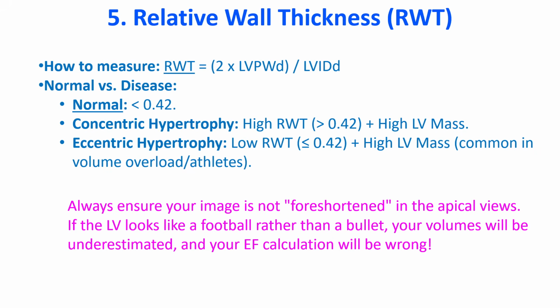Always ensure your image is not foreshortened in the apical views. If the LV looks like a football rather than a bullet, your volumes will be underestimated and your ejection fraction calculation will be wrong.